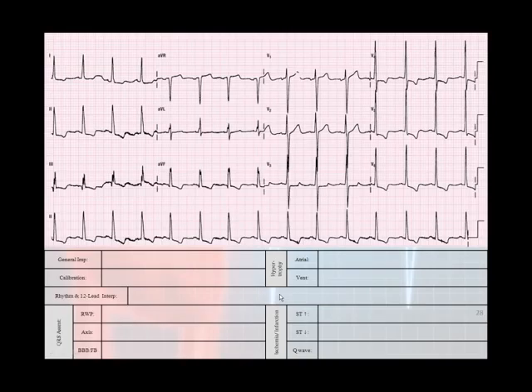When you glance at that 12 lead, you want to say, is it excessively fast, excessively slow, or any ugly morphologies? The only real ugliness you can see here is your ST segments look a little off, which doesn't actually look all that good. And you can also see here that these QRSs are actually touching. These QRSs look really tall. Not necessarily does it look ugly, but you do see some anomalies there. So for general impression, what you can say is tall QRSs, or you could just say looks fine, doesn't look ugly, but it does not look fast or slow.